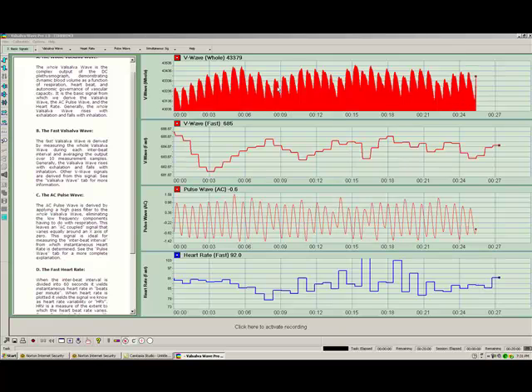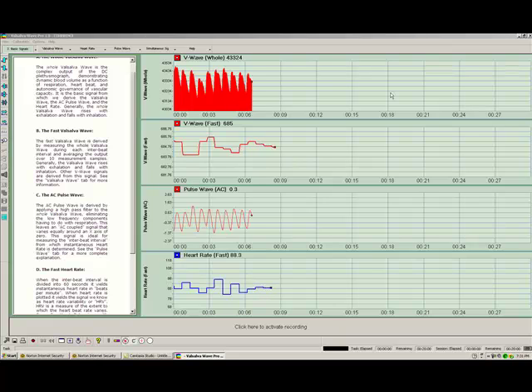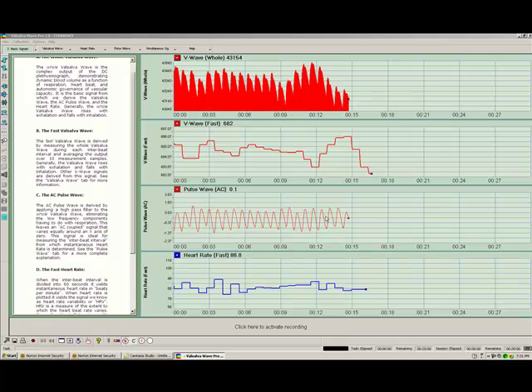You can see a more slow underlying rhythm having to do again with respiration and autonomic governance of vascular activity and blood flow. And you can see a good pulse wave. This pulse wave looks real good. From this we can easily derive an accurate heart rate variability measure.